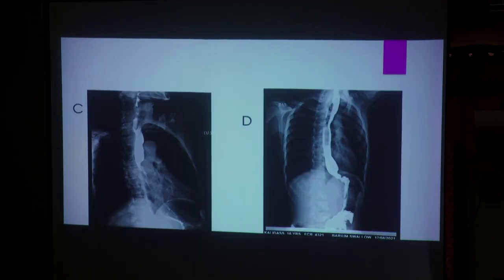Next to these two cases, of course, just to mention a malignant lesion. Here also the upper esophagus is dilated, and here you have a long segment stricture, and these are the mucosal irregularities and shouldering. So that's highly diagnostic of a malignant lesion. And the other one is the same case after a Heller's myotomy. The finding here is the ballooning. After a myotomy, in some cases this part may be even more ballooned out. Now the contrast is freely entering, but there is still a hold up of barium.